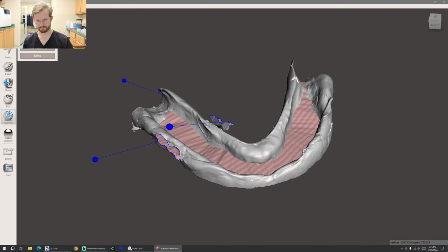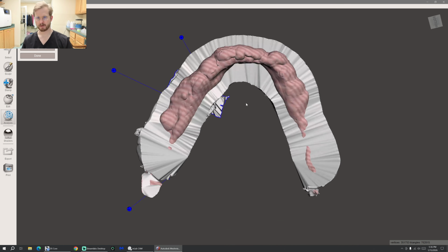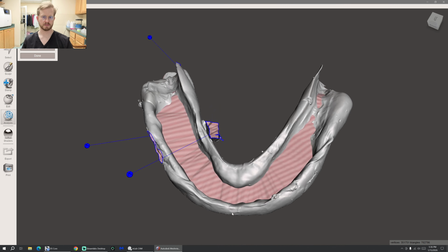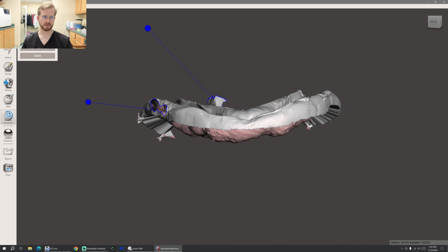There we go. Okay. So it looks like that got rid of some things. So let's undo that. There we go.